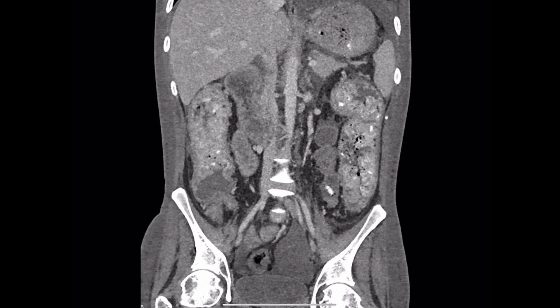So straight away we can maybe point out some structures quickly. We have liver in the right upper quadrant. We're catching a little bit of stomach here, a little bit of the spleen. Obviously some vertebrae in the midline. These are the iliac vessels here. Oh, wow. And is that the bladder? That is the urinary bladder. Okay.